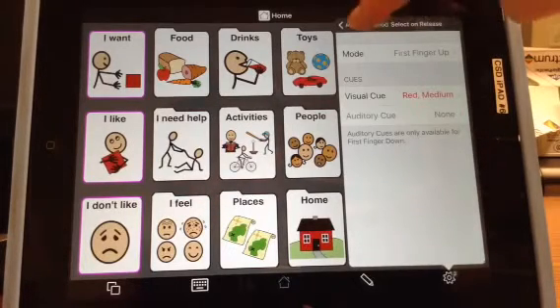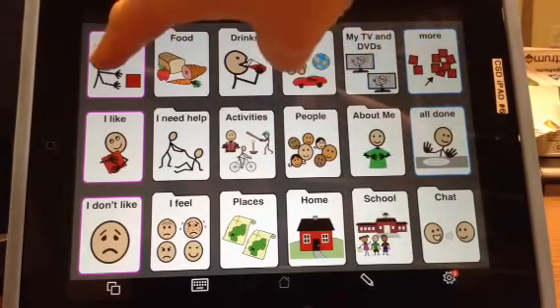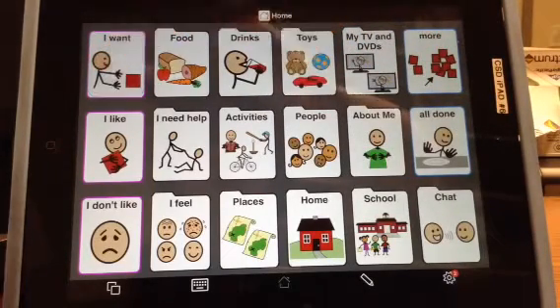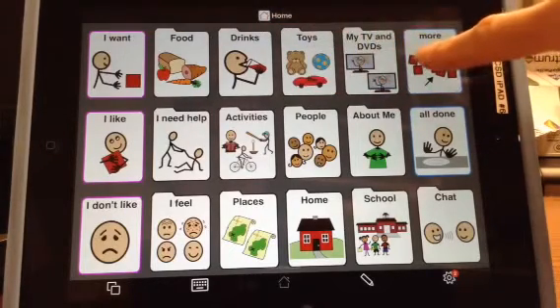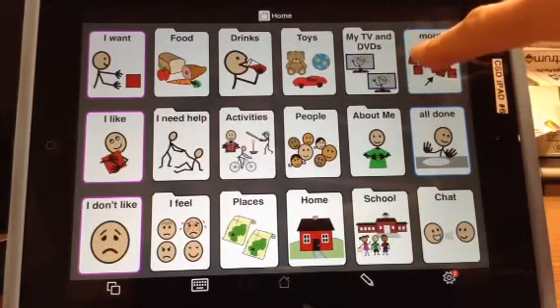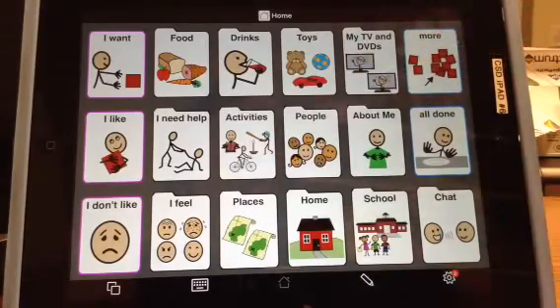Okay, so let's take a look at what that looks like. So we're going to engage the finger, wait till it turns blue. Now, nothing happens unless that circle goes blue.